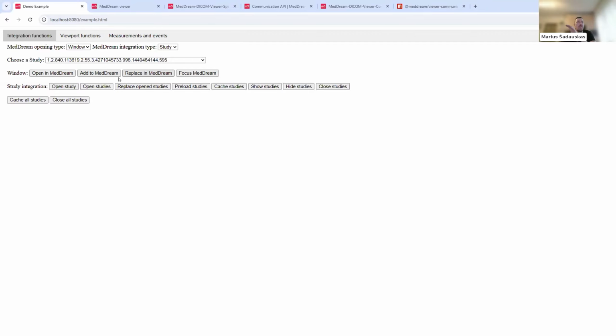So for the developers, we would recommend to first run this demo, so when you will be deploying your application, it would be easier for you to test it. I'm not going now through all this source code, because maybe not all of you here are developers, but developers can find all the source code here and see how it is doing things.